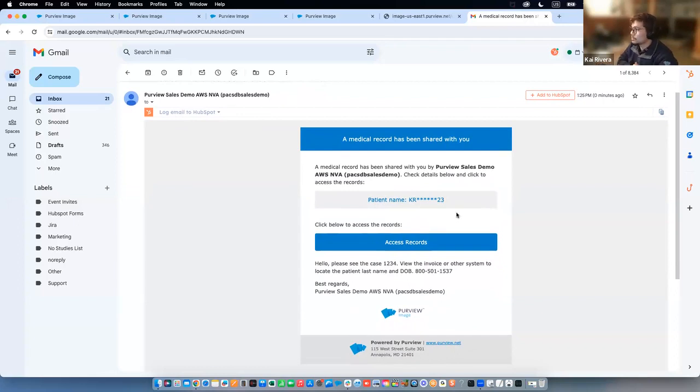So we private label the Purview platform so that when you send this email, it can have your signature here that says, best regards, Dr. Jane Doe. Here's the address, here's the email, here's phone number, and hours of operation, things like that. And here's our little logo, right? So as a recipient, once I get this email, I say, oh, okay, medical records have been shared with me. Here's the name, here's the case. Okay, great. I'm going to click access records.